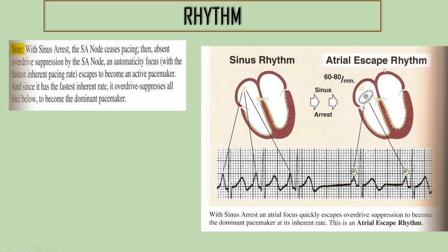Sinus rhythm, atrial escape rhythm. Here with sinus arrest, an atrial focus quickly escapes overdrive suppression to become the dominant pacemaker at its inherent rate. This is atrial escape rhythm.